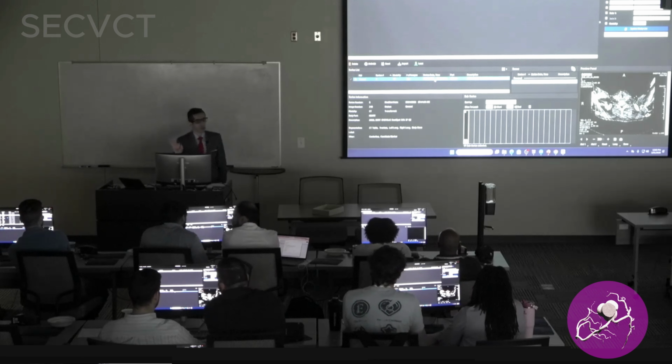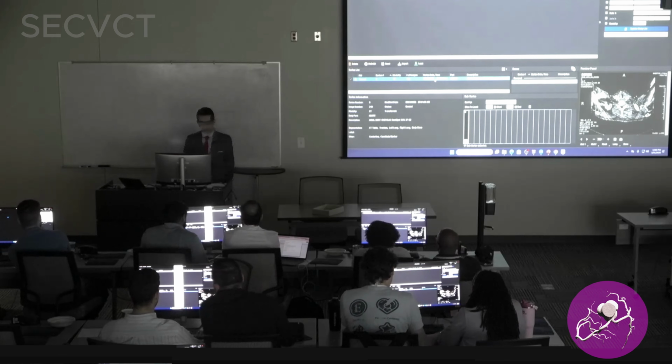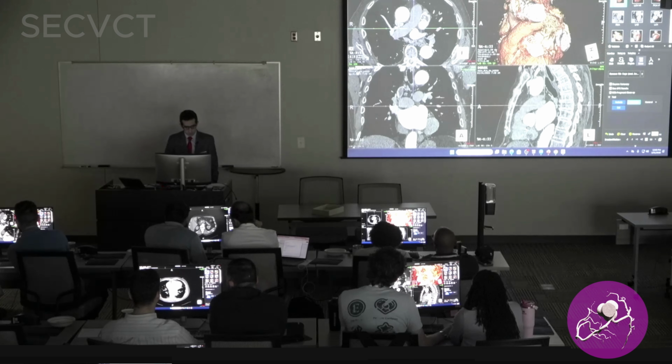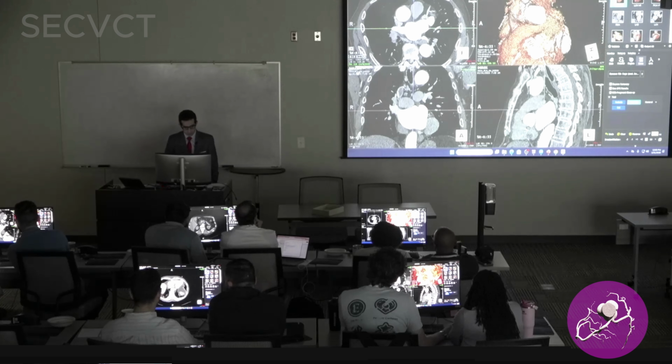And whoever solves the puzzle will go first for lunch. So let's go ahead, put it as cardiac. And I need someone to tell me what's wrong with the Watchman.